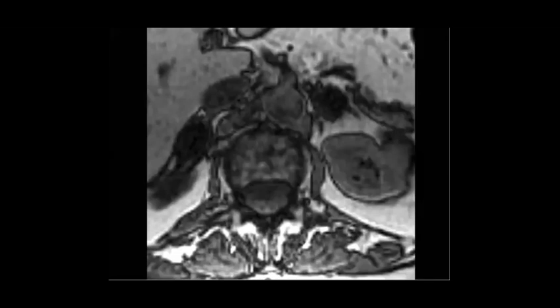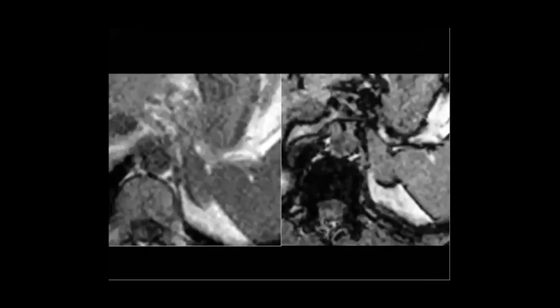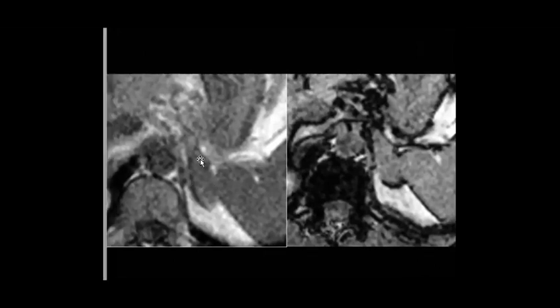Okay. Let's go to this case. As a differential of adrenal adenoma, sometimes metastasis, especially from what? It can give you a similar appearance to adenoma. It will be metastasis from lung. Yes, Rehan.